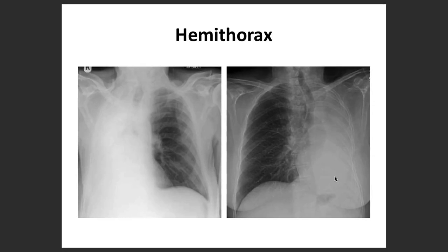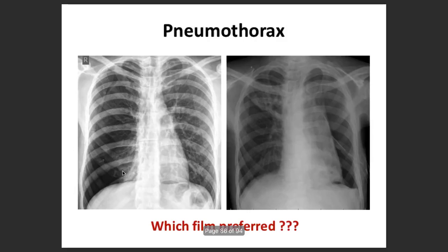And the last one, as I was telling you, remains in the middle: in consolidation, a pleural or chest wall mass, or otherwise some combination of pathologies as well. So these were some of those beautiful examples.